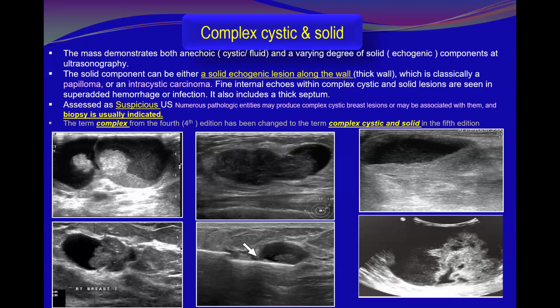The solid echogenic component can be a thick wall, a nodule along the wall, as seen in the classical papilloma or intracystic carcinoma, or it can be along the septum, or a thickened septum.